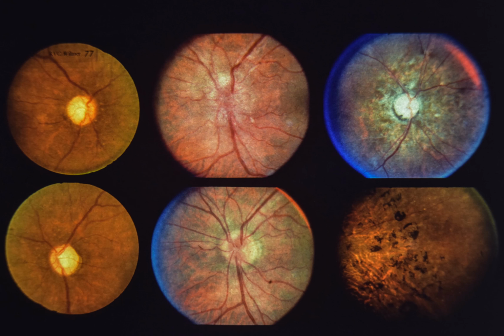This slide illustrates 4 ways that syphilis can affect the optic nerve, retina, and choroid. Upper left and lower left. This 65-year-old male had a 10-year history of bilateral progressive visual loss. Visual acuity was 20/40 OU with diminished color vision. Visual fields showed marked constriction and bilateral central scotomas. Both optic discs show temporal pallor.